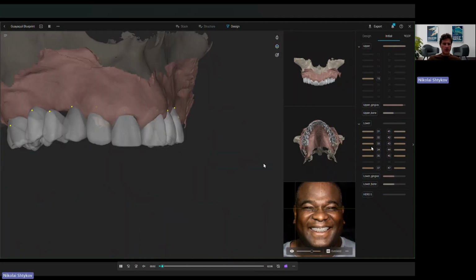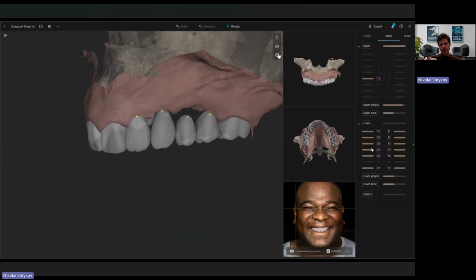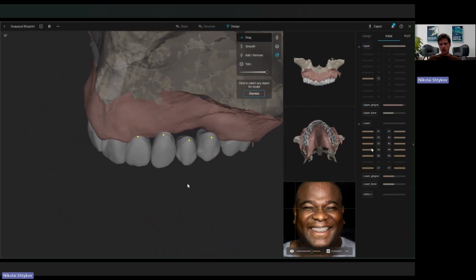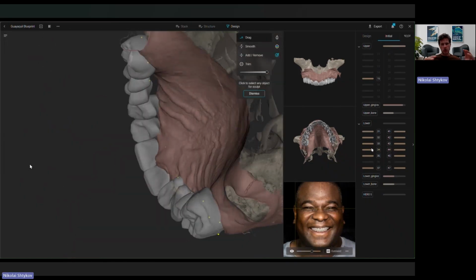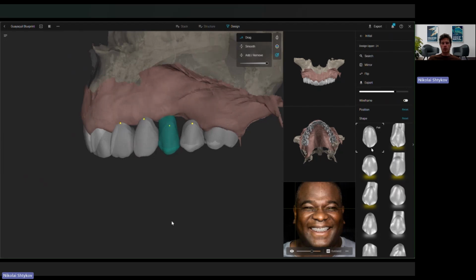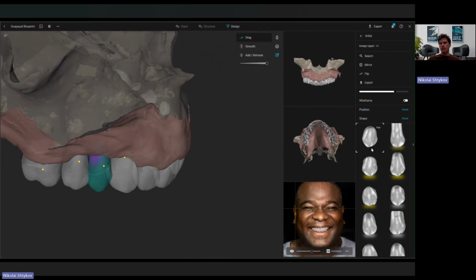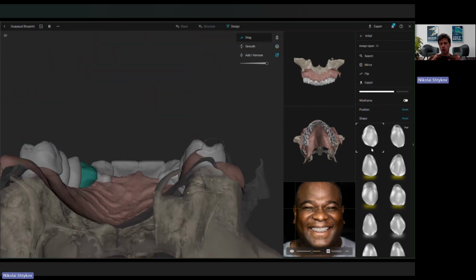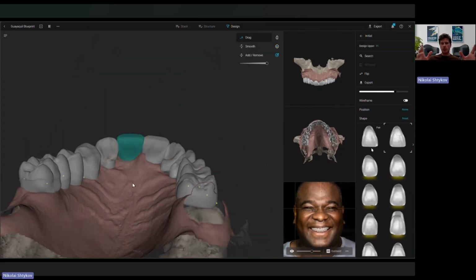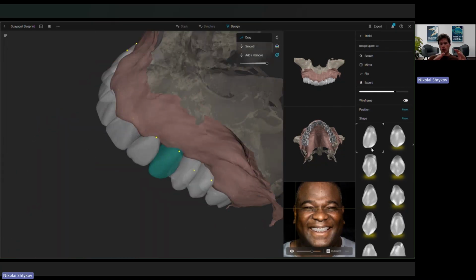You can see here the design is good, but the crown lengths are slightly shorter than they should be because we have the bone loss, because we have the gum recession. For aesthetics, for understanding, that's okay. But for the mock-up, for the future planning, for the prosthetic design, we need to increase the length of the teeth, and we also need to think more widely.